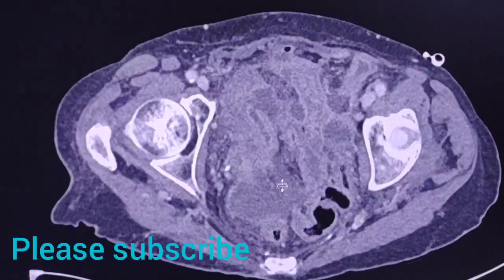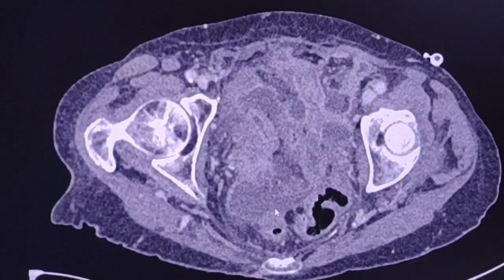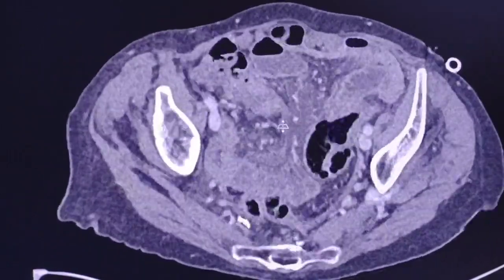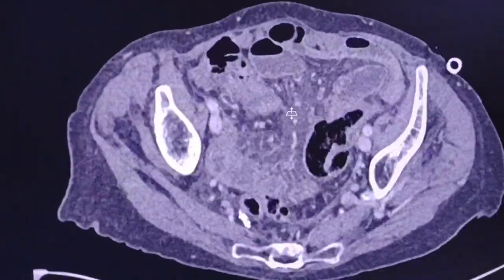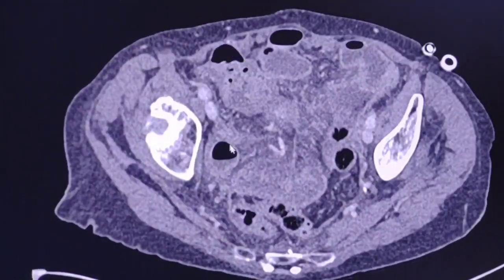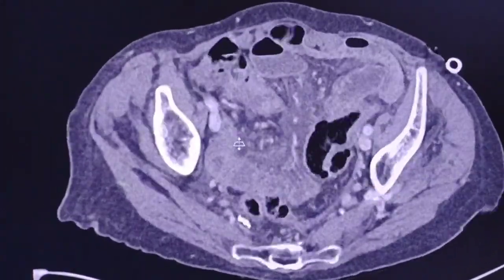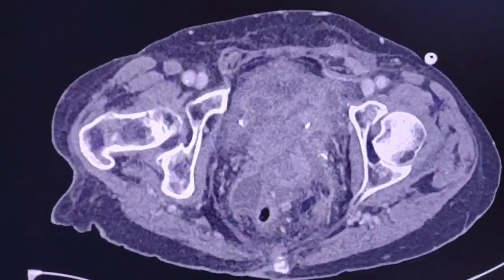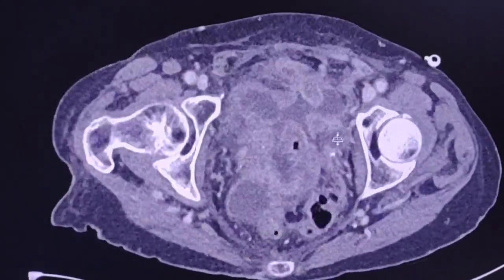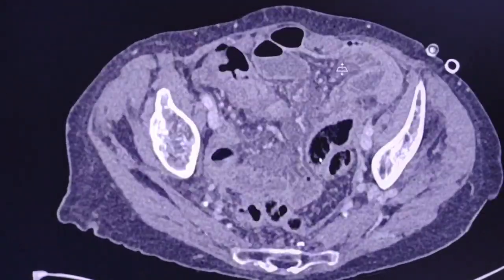Don't be confused with bowel loops. Okay, there is no physical continuation of this structure with any of the gastrointestinal tract and small or large bowel loops. Okay, probably this is a collection with air fluid level, but it's very difficult to be differentiated, to be honest. Okay, this is another collection here. So in a few words, there are some ongoing inflammatory changes.